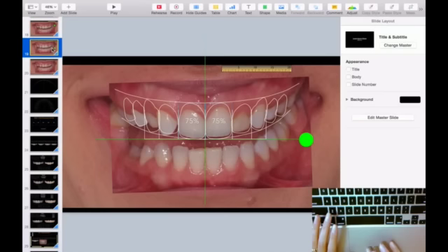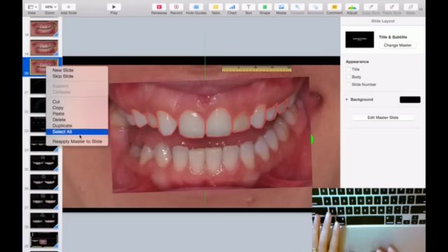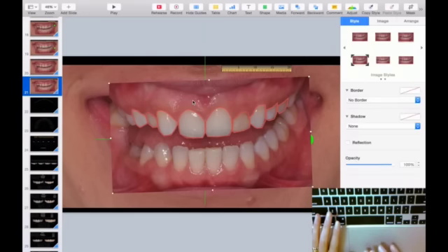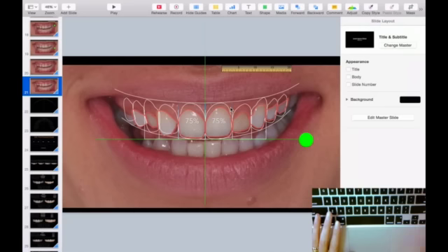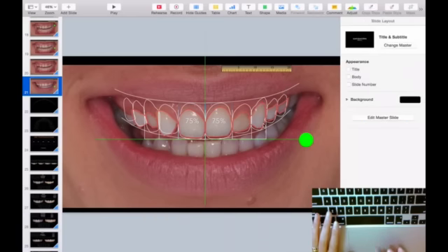So now here I have the teeth where I would like them to be, and here I have where they are at now. Okay, so what I do is now duplicate this, and I take this picture out, and here I have the positioning with the lips where they should be and where they are at now. This one should come up a bit here. Look.